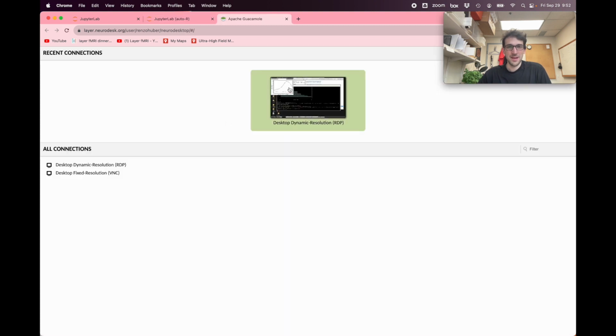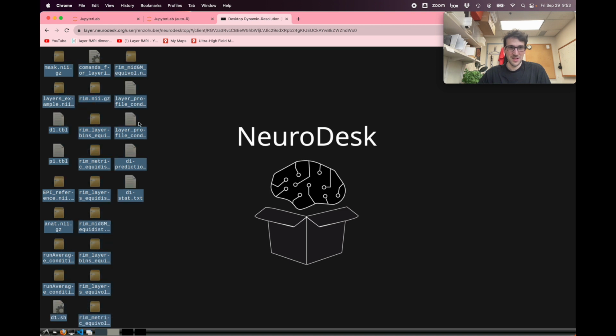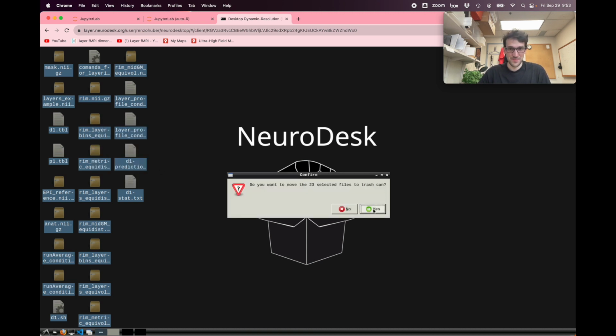there we go. And it might remember my previous setup. Here we have a little screenshot. I'm not sure if all the windows will still be open. The windows will not be open, but we still have a lot of stuff from our first session. So what I'm going to do now is delete all of this. I drag and drop with my mouse over all the things that we did so far and delete it, because we're going to do something new now. So I move this to trash.